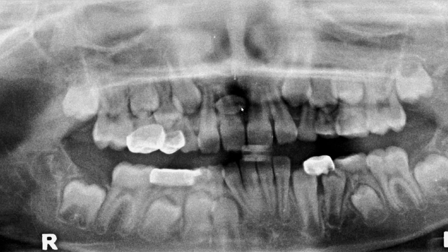But this is something that you should be able to catch, even if I didn't give you a clue as to where to look. When I look at panoramic radiograph, especially of someone with a mixed dentition, it's a good idea to count the whole teeth and overall eruption status. Make sure the teeth are developing and erupting in a sequential manner and bilaterally. So here, that's an area of concern, as a matter of fact. Let me see if I can zoom in even more.